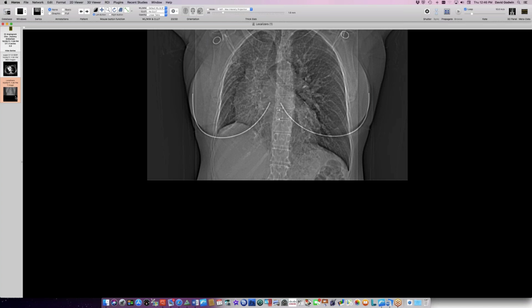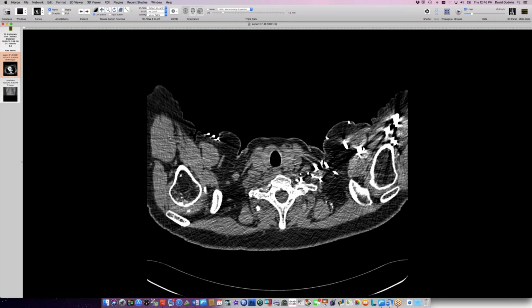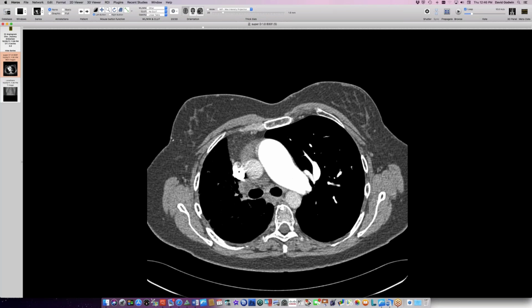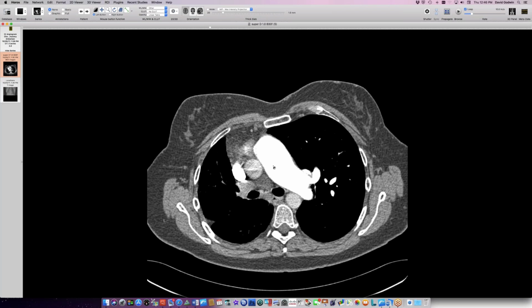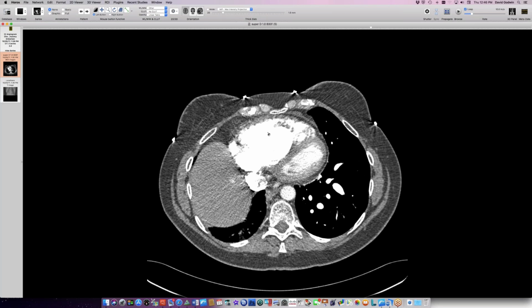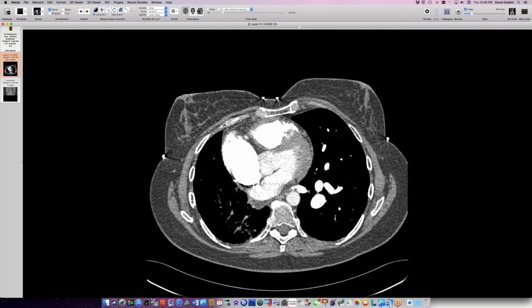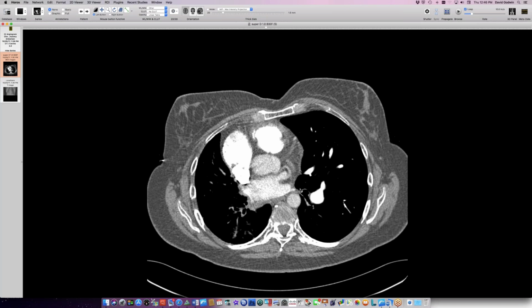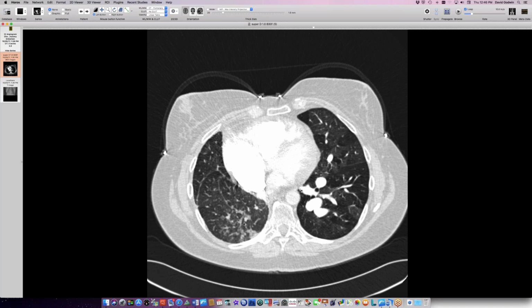So here's a person, I think in her 40s or 50s, who has this asymmetry of the lungs here and a biggish heart. And here's her CT scan. I don't really have a formal chest radiograph, I just have that scout view. She's got this hugely dilated main and left pulmonary artery, and she has severe pulmonary hypertension and a very hypertrophied and dilated right ventricle, flattening of the septum and so forth. And she has no right pulmonary artery. So this is a congenital interruption of the right pulmonary artery. Then she's got this patchiness in her lungs, so it really looks like mosaic perfusion here.